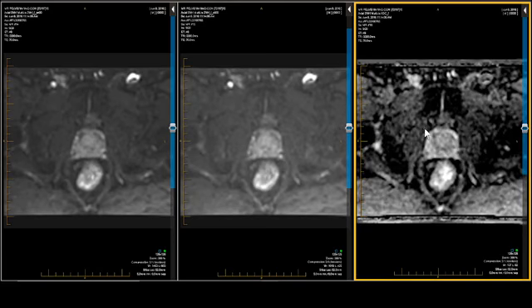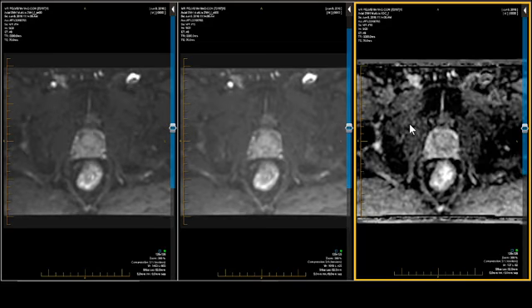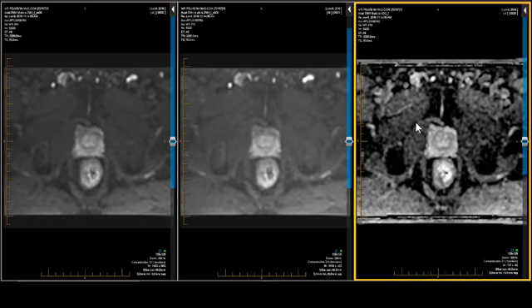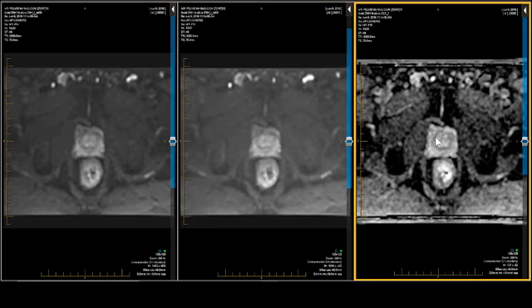And you get these little spots at areas of signal decrease, or signal poor areas will show up as dark on the ADC map. That can either be from fibrosis or pixelation or a number of other causes that we'll describe in the pitfall section. But in order to have an ADC map abnormality, I want it to be 3 to 5 millimeters or greater. And we don't have that. That's about 1 millimeter. So negative ADC map, negative diffusion image for the peripheral zone.